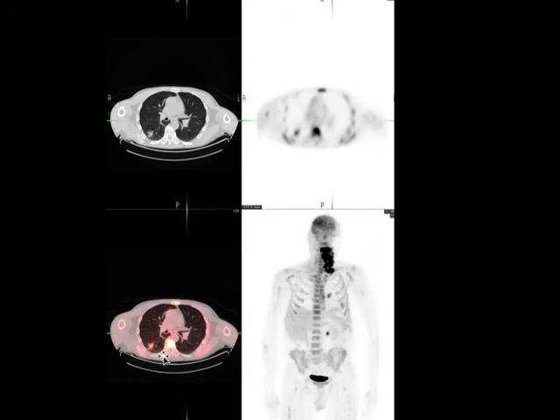The risk factors for head and neck cancer and lung cancer overlap in form of tobacco use, and frequently in patients with head and neck cancer we find incidental synchronous lung malignancies, like in this patient.